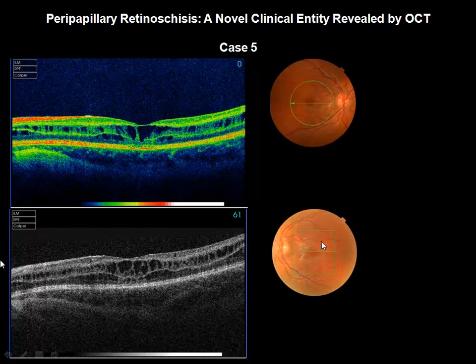Going back to a patient who has X-linked retinal schisis, so here through the macula, that's X-linked, and this patient will have a different electroretinogram, will be electronegative because of the Mueller cell abnormality, and you might see radiating folds in the macula. So we can usually make a differential diagnosis based upon age of the patient and based upon location. So all the retinal schisis are pretty interesting conditions.